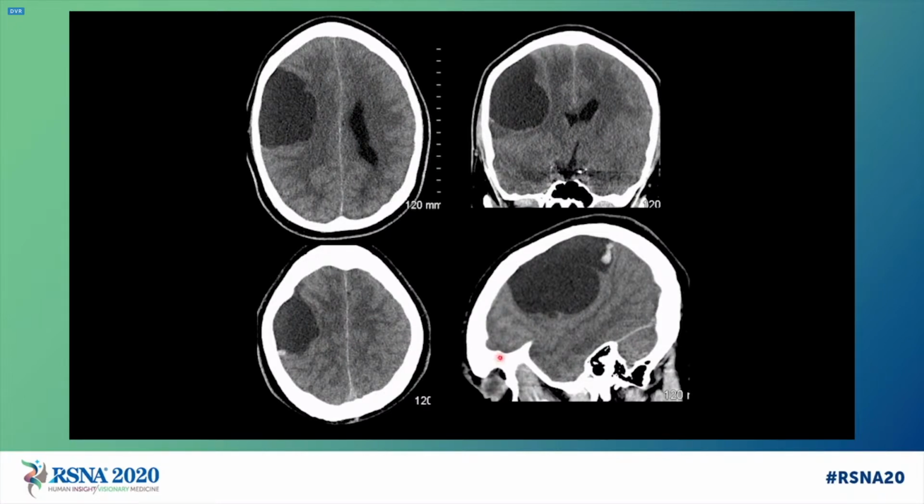In the ED, we can see that there is a large hypodense lobulated extraaxial lesion centered in the right frontal parietal region. That lesion demonstrates focal areas of increased density suggestive of acute bleed. This lesion also demonstrates a septation towards the posterior aspect of the lesion.